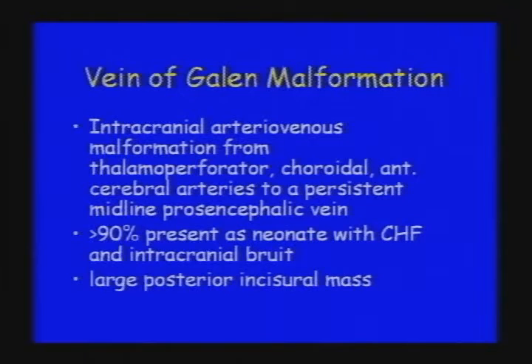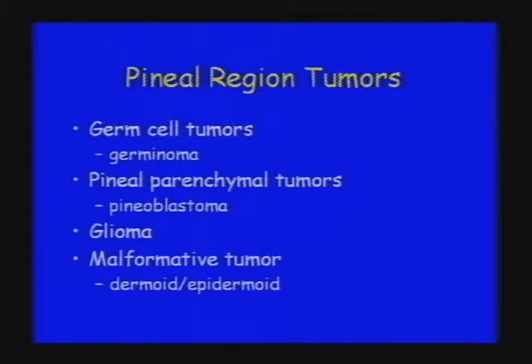Most present in the neonatal period. There's congestive heart failure because of the tremendous flow through this arteriovenous malformation, and they have a large fluid density incisural mass. What other pineal region tumors are there?